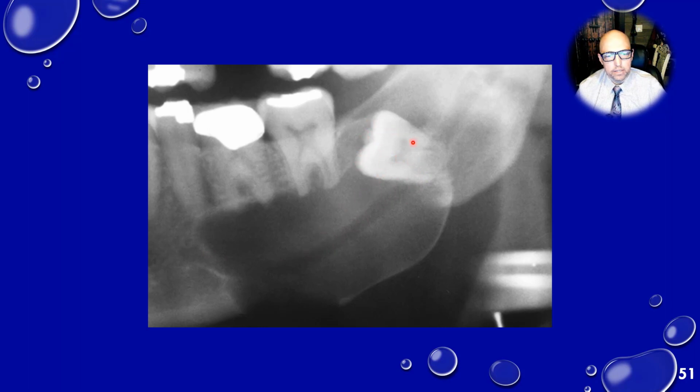Is it displacing this tooth? Is it causing this tooth to remain impacted? Possibly. Is it associated with the crown? So you may be thinking, okay, is this a dentigerous cyst? Does it attach at the CEJ? Really, it attaches lower. I don't really see the attachment on the distal surface. So you might have OKC at the top of the differential, and I would agree with that.